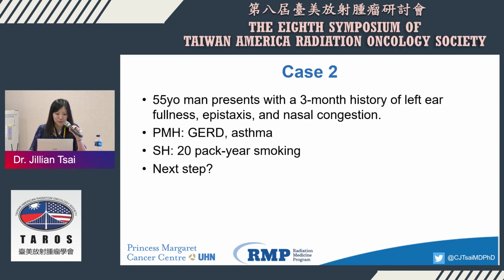All right, so the next one is the nasopharynx, that everyone here should be expert in because we see so many in Taiwan. This is a 55-year-old man with a 3-month history of left ear fullness, epistaxis, and nasal congestion. 20-pack year smoking history.